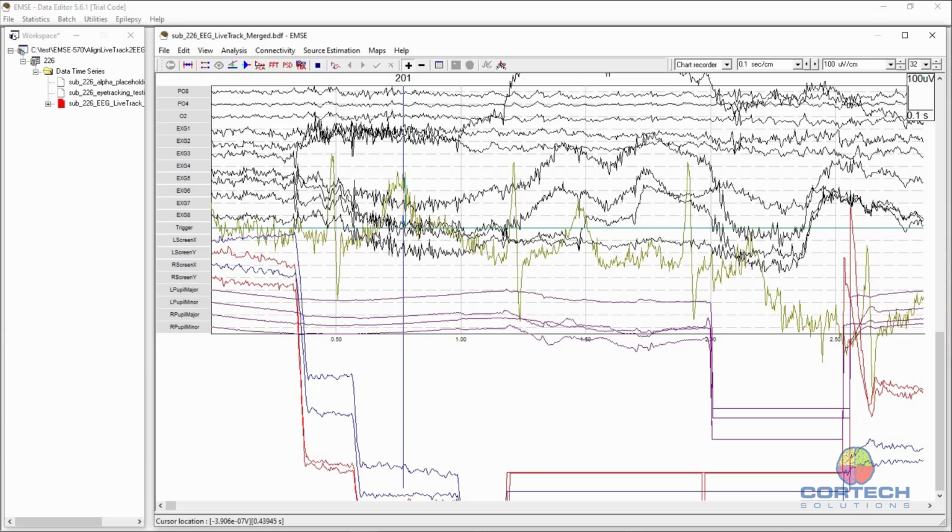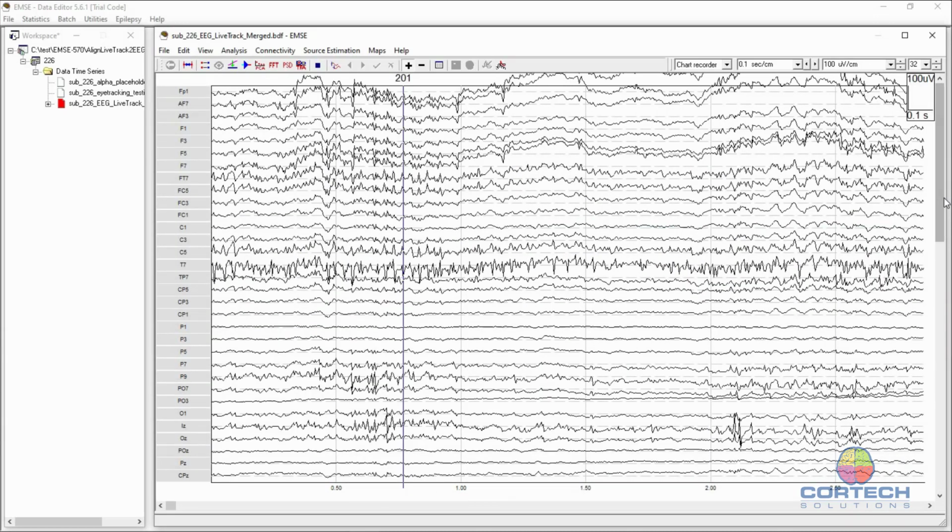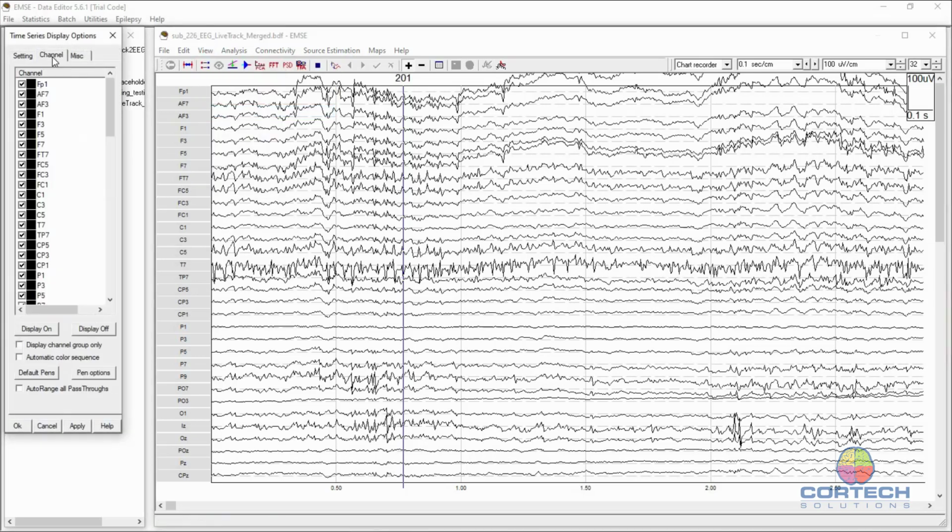This is the ECG channel number 7. There's also a trigger channel. At first, what we really want to do is confirm that the triggers are well aligned. So to do that, let's just look at the trigger channel by itself. Let's go here.